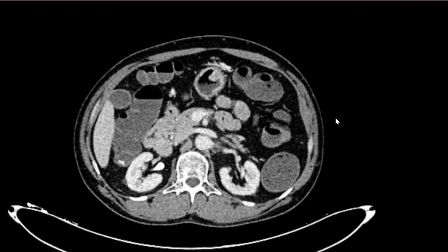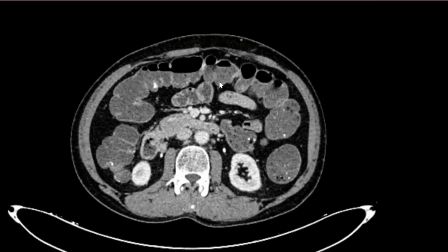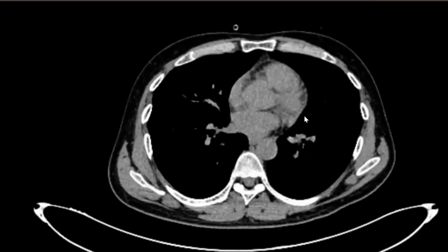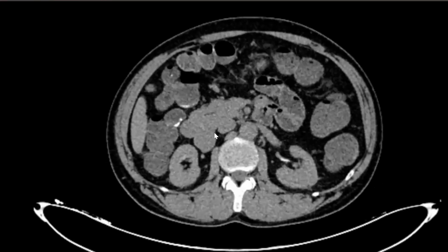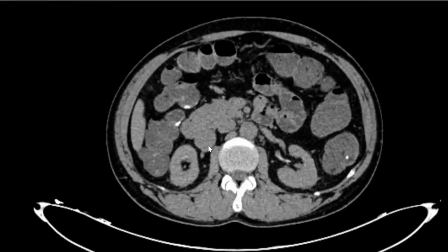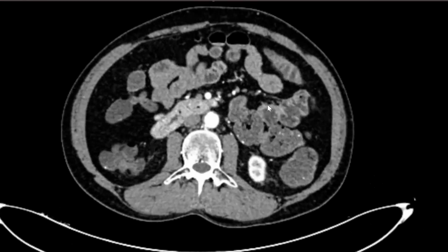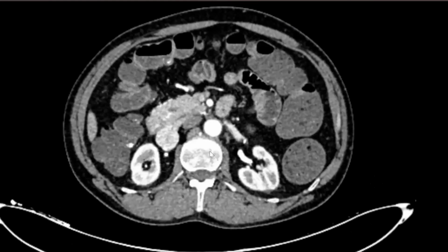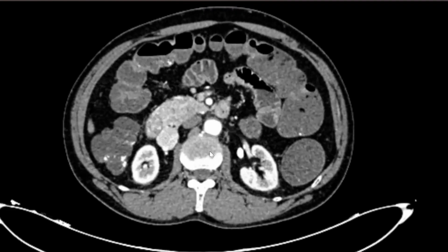And you were good on the part that if you're suspecting peptic ulcer disease, you would be looking at the lung windows for any evidence of pneumoperitoneum, right? But the main pathology over here, which ideally one should have at least picked up, can you see this large lobulated lesion over here adjacent to the duodenum? Yes. I'll just show you an arterial phase, how well it is enhancing. Can you see this lobulated lesion over here? Yes. So I think you missed this.